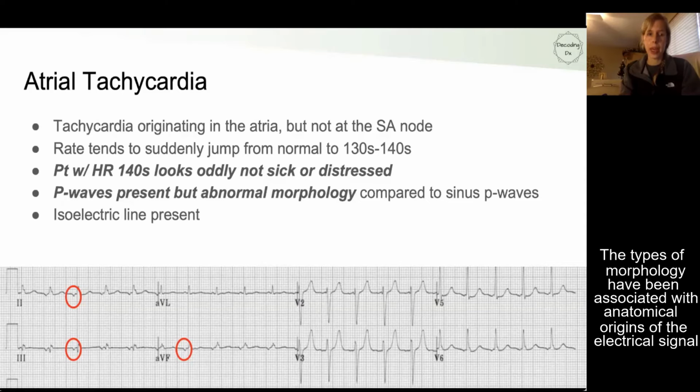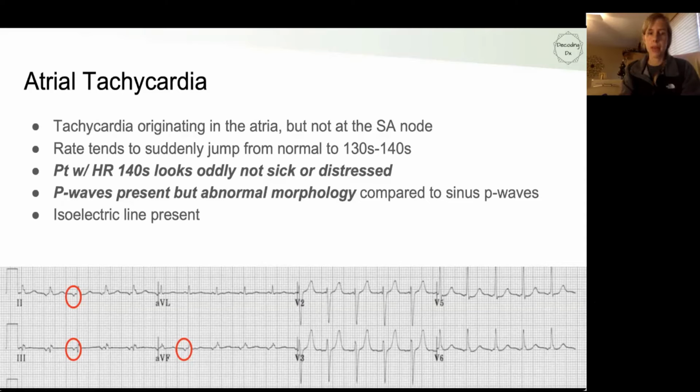So again, if you compare in lead 2, you can see that that P wave is inverted. And then if you look over on AVL, the P waves actually look kind of normal. So you're looking for some instance where the P wave looks different and the heart rate jumps.